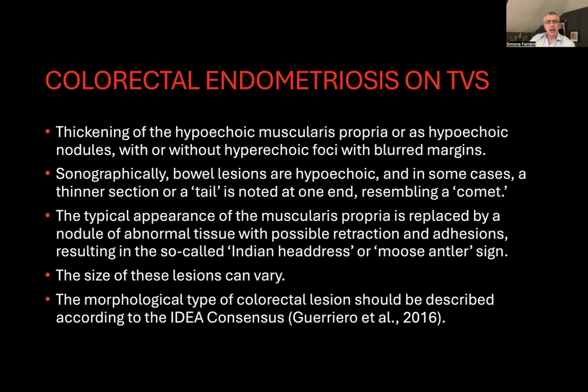On transvaginal ultrasonography, colorectal endometriosis appears as a thickening of the hypoechoic muscularis propria or as a hypoechoic nodule with or without hyperechoic foci.